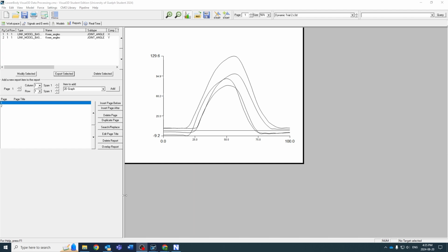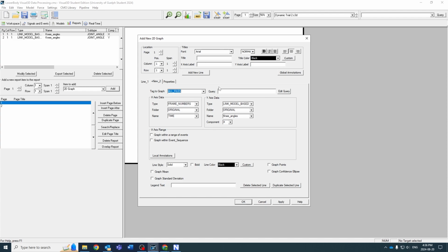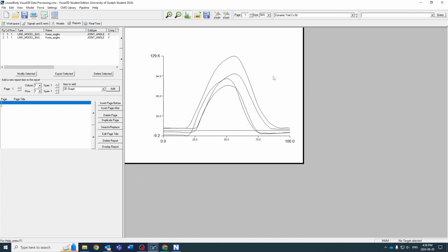Now you might tell yourself, what can I do with this graph? It's very confusing, it doesn't have labels, it's hard to edit. You probably don't want to use all of these old school methods of creating a graph. So the good news is we can export the raw data into a TXT file where we can import it into Excel or MATLAB to create our own plots.